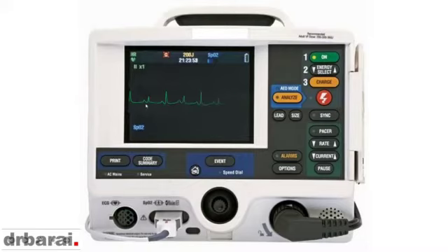The alarming feature is the height of the QRS complex is alternating. Height of the QRS complex is short, tall, short, tall, short, tall. This is cardiac tamponade. I have got a separate video, actually quite a few videos on the cardiac tamponade and the bedside echocardiogram. And when we did the bedside echocardiogram of this patient, which shows a large pericardial effusion and the heart was moving side to side like a dancing heart.